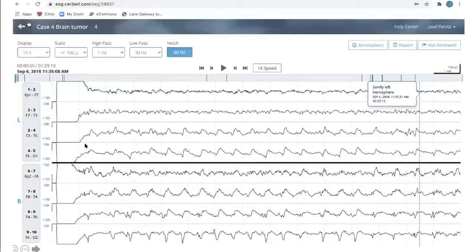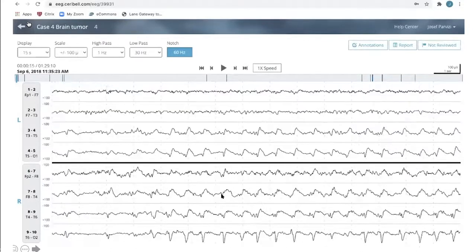Okay, wonderful. So are you ready for seeing some EEGs? Yes, please. Okay, this is the first 15 seconds. I see across the right side and posteriorly part of the left side, a recurring wave that has the same shape with each occurrence. It looks like a sharp and slow wave pattern. So it has epileptiform features and it's ongoing. And so it looks like a seizure in the sense that it's persistent and has the shape of a seizure.